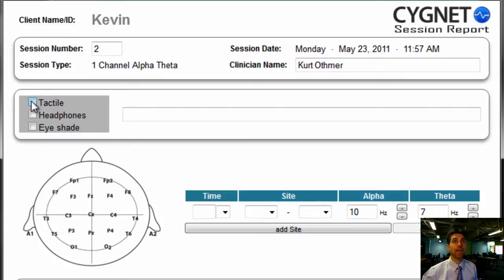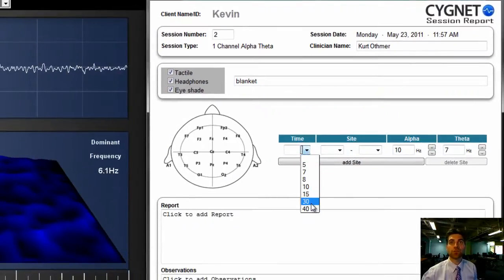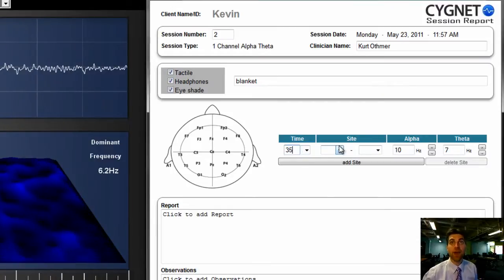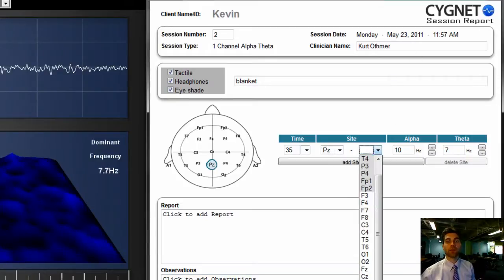So let's go ahead and say, yeah, he likes the tactile, and he likes the headphones, he likes the eye shade, and he also likes the blanket. Now, we're going to say he's going to do 30 minutes here. Again, if I wanted to change that, I could type in and say 35. The site he's going to use is going to be PZA1, all the way down at the bottom here.